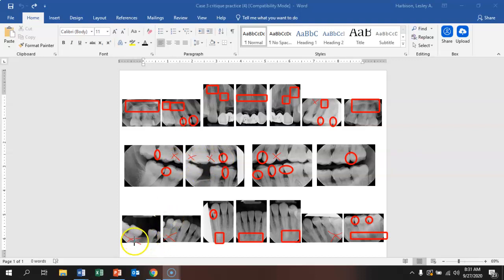We also can't see the apices down here, but that's not going to show us these interproximal spaces. So my goal would probably be to take a film somewhere in between. We already have the distal of the canine here and the distal of the canine here. So my goal would probably be to take one retake and have it be set back a little bit so that we try and open up both the interproximal space between the molars and the molar and the premolar.